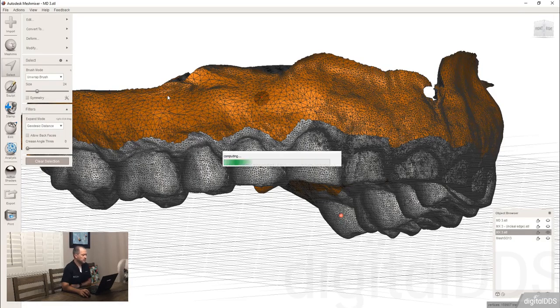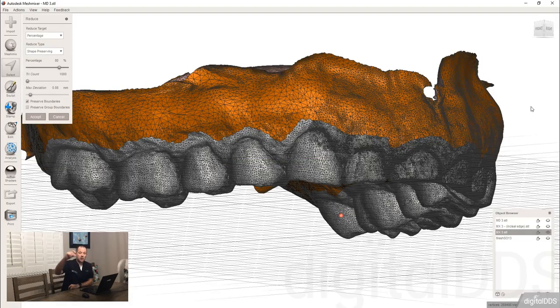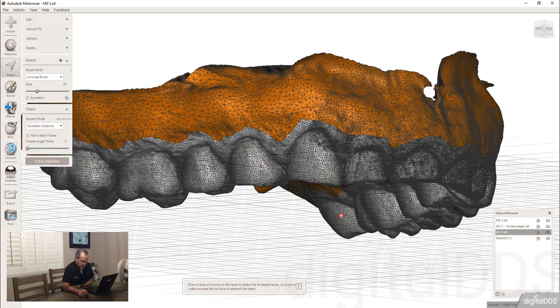I'm going to hop back into the tool. I just did Control Z to undo, because I had made that one band that went across. Oh, I didn't even have that checked. Never mind. All right, let's just hit accept. We're going to leave this alone, but you can see we're all the way down.